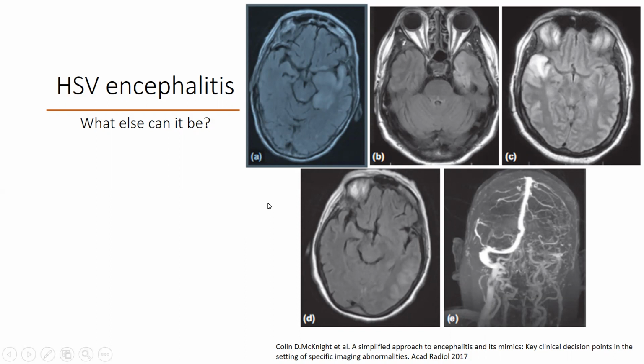The first image I have already shown you is a case of herpes. Try images B, C, and D. What is the finding and what is the diagnosis? Possible diagnosis.